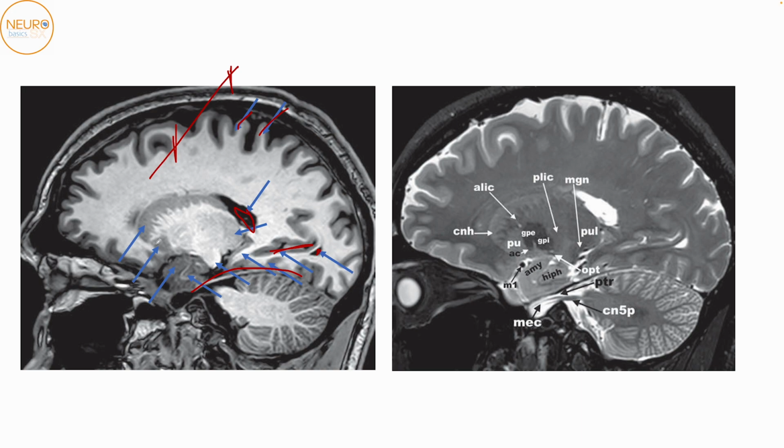Okay, then next, after the putamen, this was actually the putamen, and this is your amygdala still. Okay, so after the putamen ends, you'll be able to see the C-shaped structure which is made of grey matter, and that is your caudate nucleus.